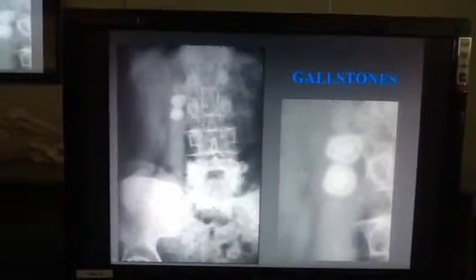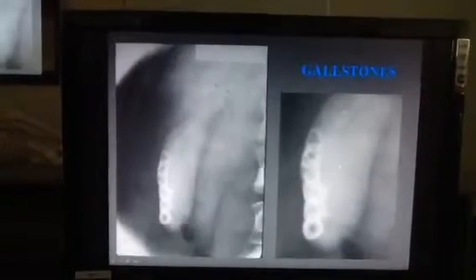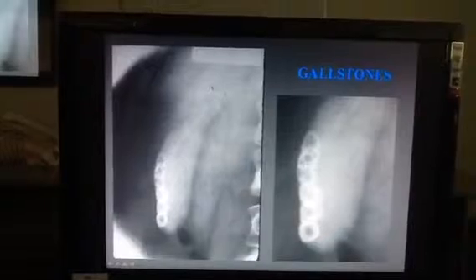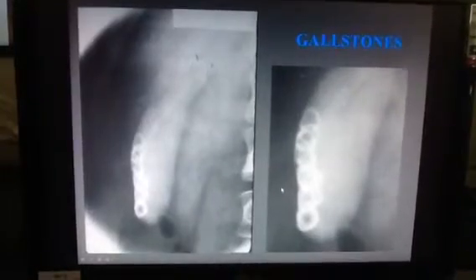More cholecystitis cases. Remember that the lucency here is going to be cholesterol, like the little rings. Like here, it's cholesterol. Remember that this would have to be a decubitus. The patient would have been lying on this side. There's no way you're going to have all these stones stacking like that. That doesn't make sense.